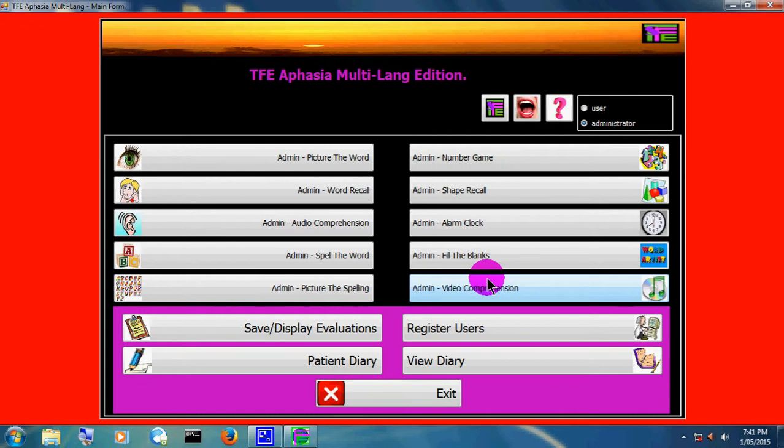Now, as it is, you will not have a necessity or requirement to bother with manipulating or changing the database, because 100 records have been already uploaded in each of the 10 applications, 100 here, 100 there, etc. It's already uploaded, and at any point in time while the therapy goes on, only 10 records are actually visible to the patient. And I will now walk you through how you set these 10 records for the patient to work on.